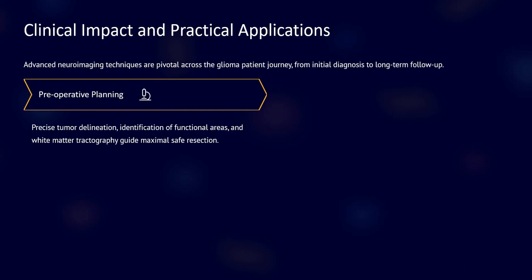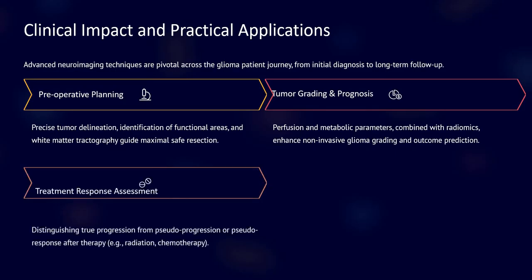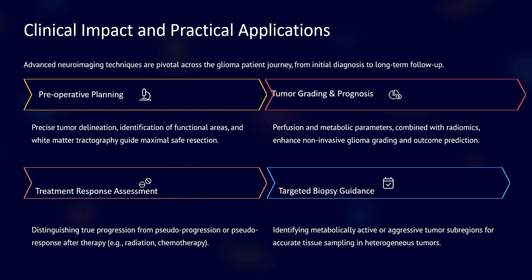So in preoperative planning, we need precise tumor delineation, identifying functional areas and white matter tractography, grading and predicting prognosis. Perfusion and metabolic parameters combined with radiomics enhance non-invasive grading for glioma. Treatment response assessment means differentiating progression, pseudo-progression, response, pseudo-response, radionecrosis, or recurrence, and targeting biopsy guidance.